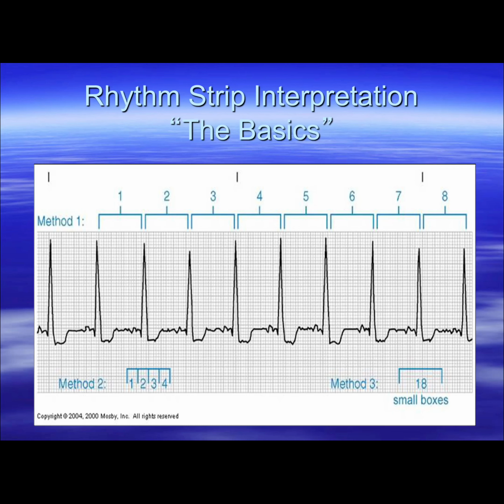Let's talk about getting rates on our rhythm strips. To learn rates, we're just going to talk about ventricular rates, the R to R, and we're looking at QRSs. For the 6-second rule, we're going to count the number of QRSs in a 6-second strip, take that number times 10 to get our beats per minute or R rate. In the above example, we have 8 QRSs in a 6-second strip, and that gives us 80, and that's a good ballpark. But let's get even more accurate, counting big blocks and little blocks, shall we?